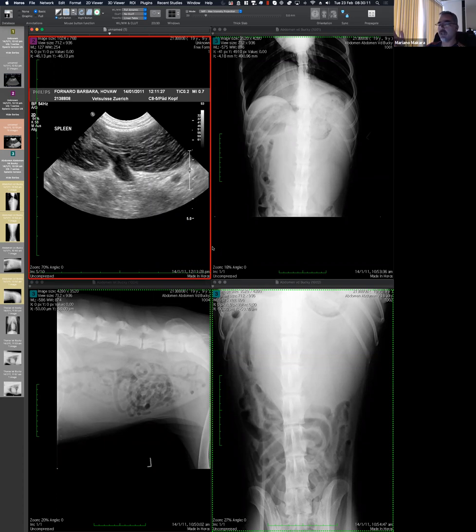I don't know. I'm thinking there's a mass effect. The option of a mass was still there. What if there are mets in the liver? What if the lymph nodes are super huge? What if you see seeding of the peritoneum? I don't know. I'm trying to justify it in this case.